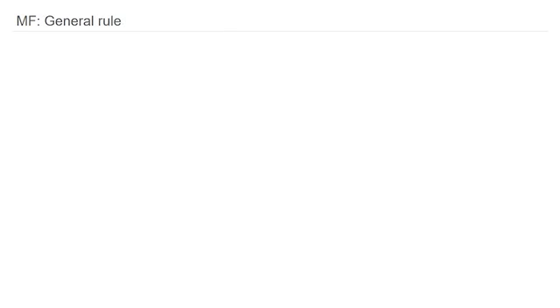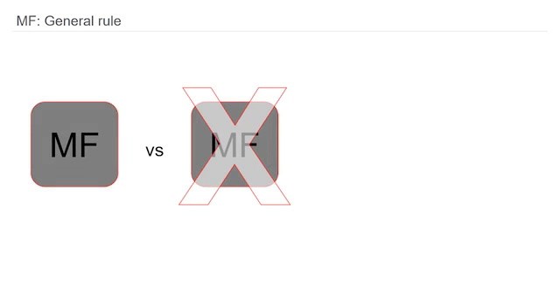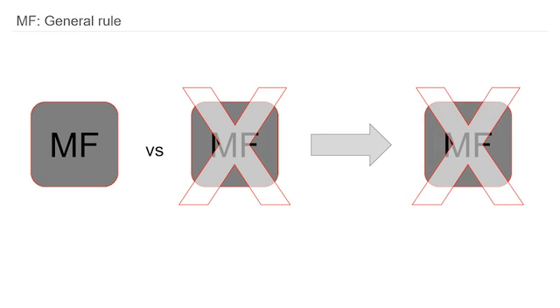So what is a general rule that we have to remember when talking about major features? If we're trying to figure out if the major feature is present or absent, the general rule is categorize this feature as absent. So again, if you're trying to figure out is there arterial phase hyperenhancement or not, you should characterize it as no arterial phase hyperenhancement.